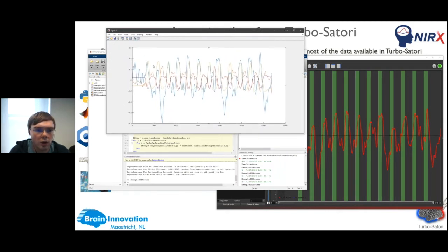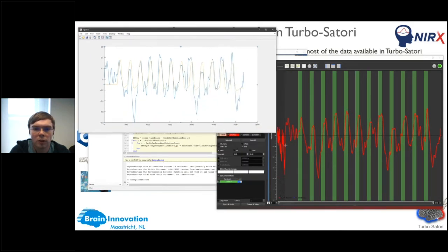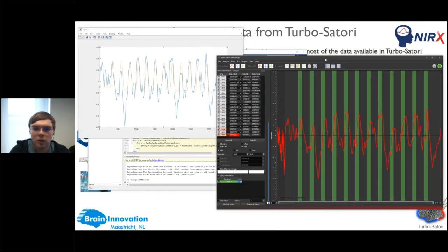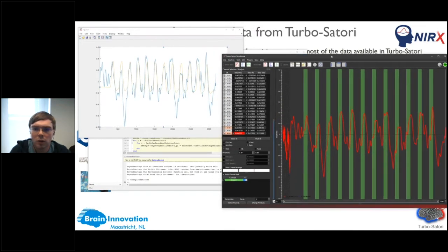So basically grab the design matrix and the conditions. So just clean now the deoxy part so that you can see the oxy part. And as you might already see, the signal looks very similar. So this is the same signal that we're looking at.